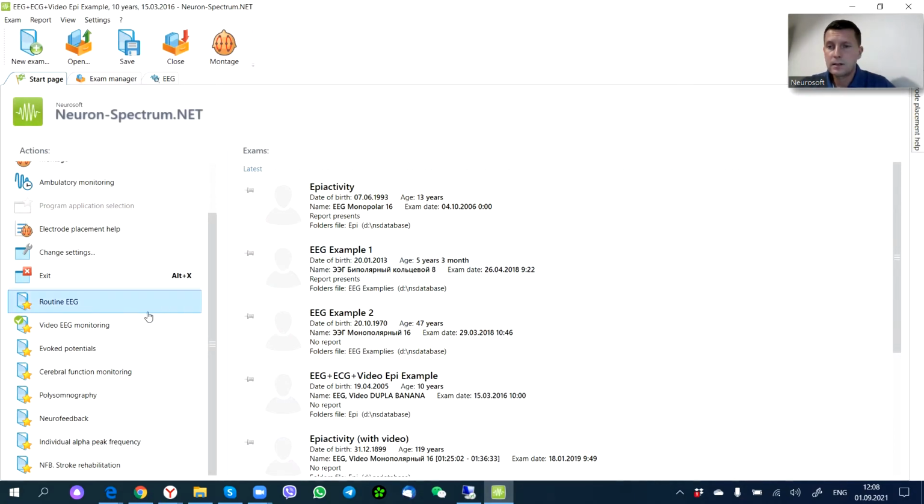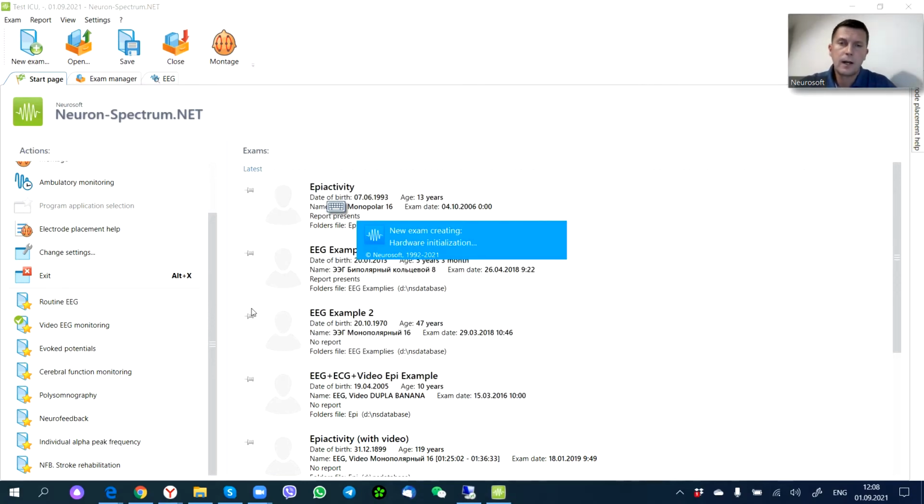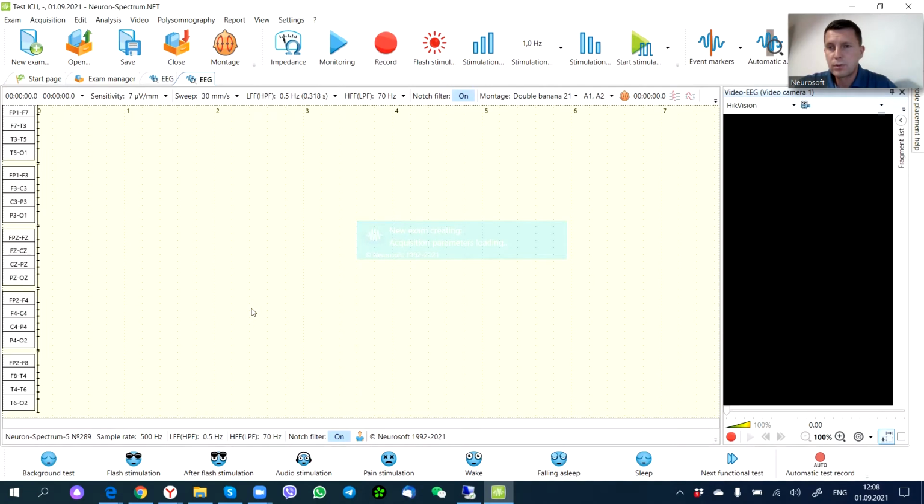Now let's start our new examination using the template video EEG monitoring, this one. First of all, I need to put in all information about my patient. For example, like this. I can also put in age, sex, diagnosis and so on, but now I just put in only the name.